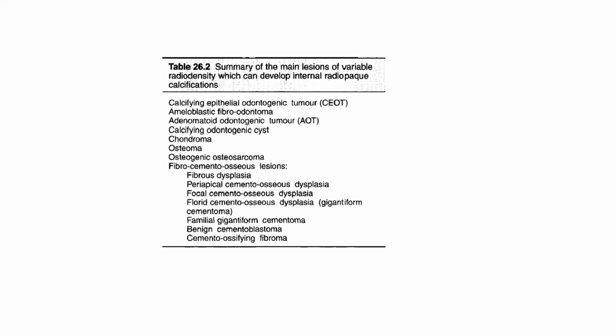So this is exactly what's happening, and that's the sunray appearance that you have. It's basically a very fast periosteal reaction to the lesion. This sunburst appearance is an aggressiveness appearance, as if the lesion has developed really very fast.